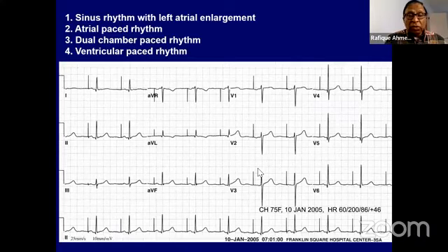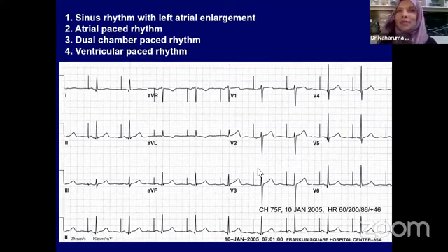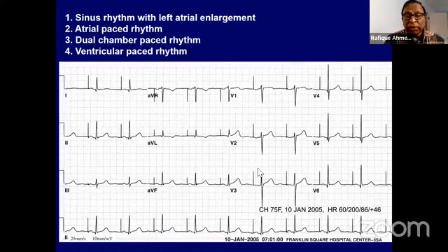Yes. So while they're doing it, there is a question from Dr. Manoj Koirala. RBBB due to conduction defect versus RBBB due to atrial septal defect, is there any difference? In ASD, it was due to stretching effect due to volume overload. In right bundle branch block, the pathology and physiology will be different, but the findings in ECG are the same. So we'll have to look at right axis, left axis, and clinical features, right?